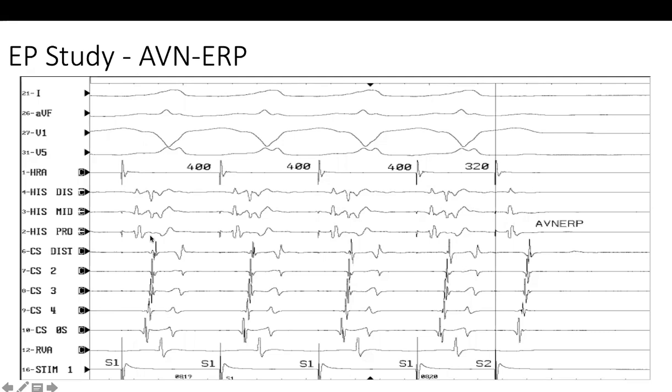Therefore, it makes the orientation a little bit more difficult. Therefore, I would urge everybody to look for the labeling in the exam before you start answering, because the labeling will tell you a lot.